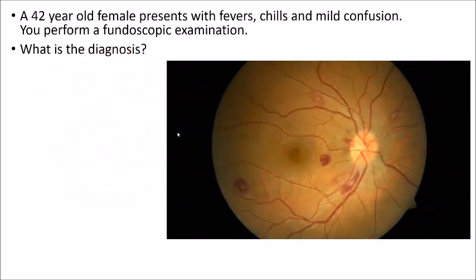Now this is your challenge given in the first slide. What will be the diagnosis now? Please. This is infective endocarditis. Very easy now. Anybody else with a difference of opinion? Roth spot. The retina is almost normal, the disc almost normal, but near the disc there is a bleeding area containing white. For that, Dr. Mahbub, you are telling Roth spot?